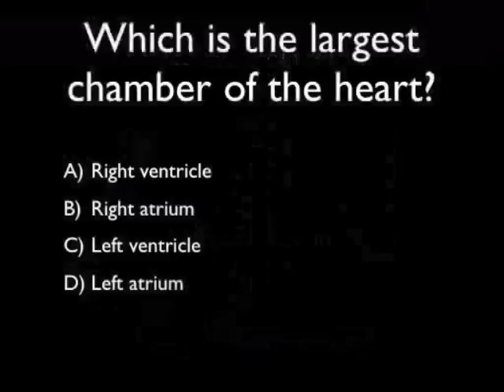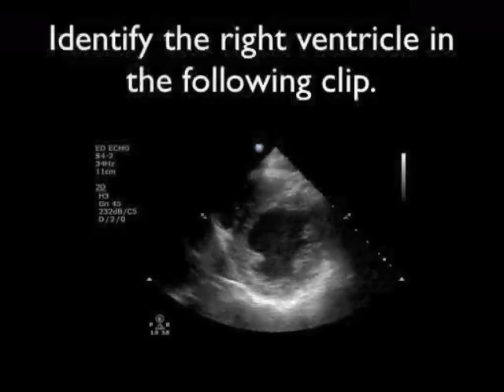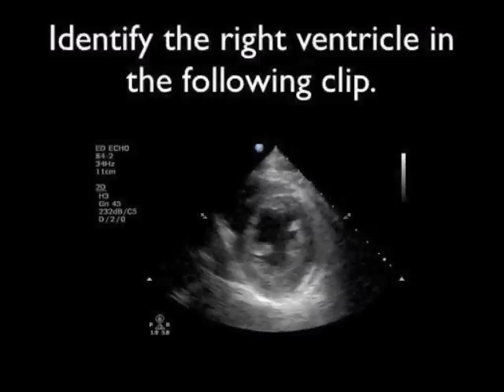Which is the largest chamber of the heart? It's C, the left ventricle. Identify the right ventricle in the following clip. This is a parasternal short-axis view of the heart. Notice the big left ventricle. The right ventricle is to the left of the left ventricle.